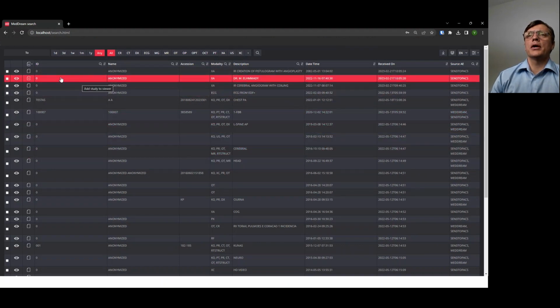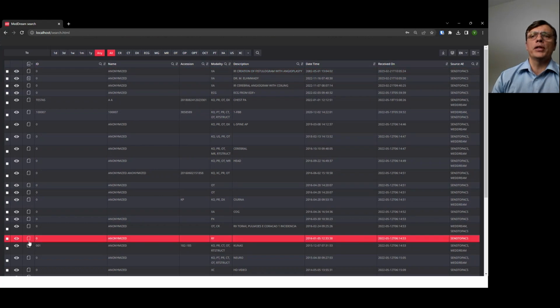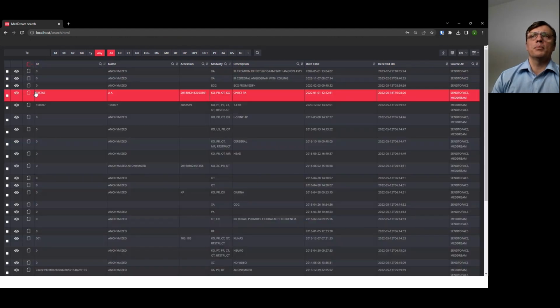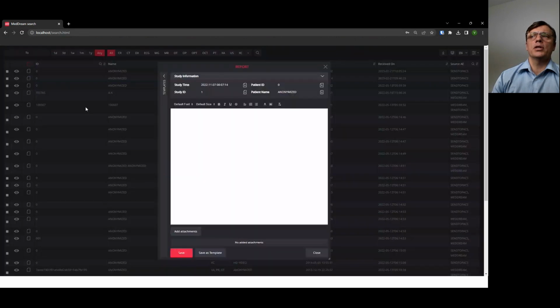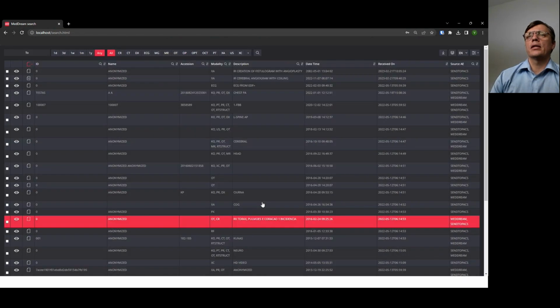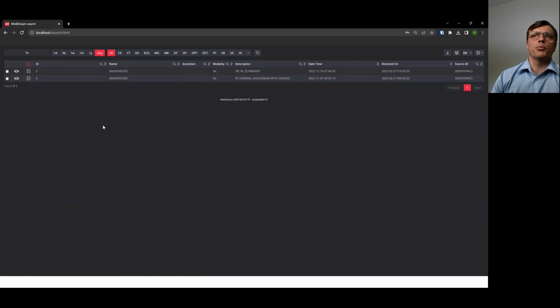So first, as you see here, I can show reported and not reported. In the previous version, there was no filtering for the reports. Now I can see reported, and I have only one reported case, and I can create an unreported one. So if I select unreported, click and report something, save it, and again change the filter to reported, I see 2 reported cases.